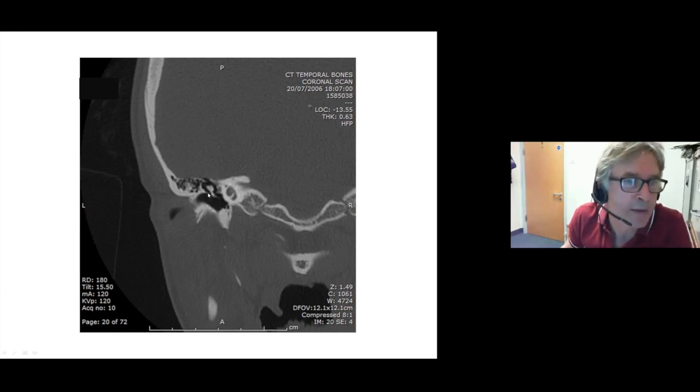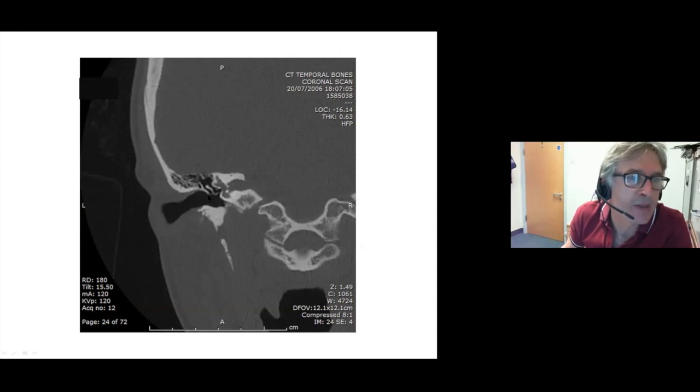And you can see why, because of that, let's just go on to the next slide. Because of that, scutum is very vulnerable, as are the ossicles. And you'll often see cholesteatoma heaping up in this part of the attic, just here, eroding the scutum and the ossicles as they go.